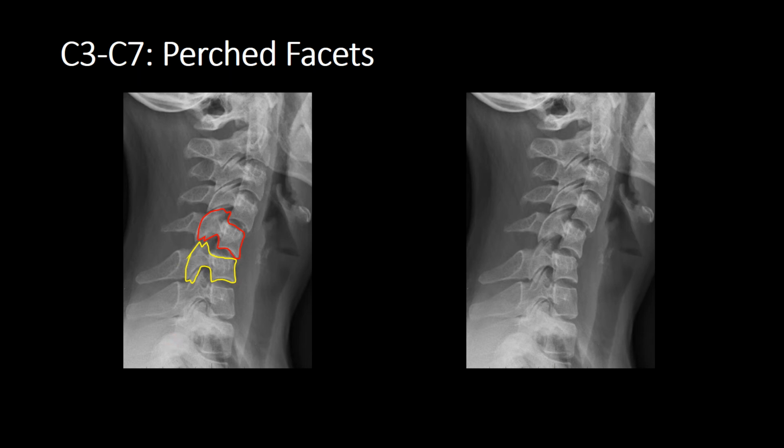Let's look at the interspinous distance. So we've got virtually no interspinous distance, but as we can see we've got rotation here, and so therefore this is normal, should not be misconstrued as abnormal. So remember with that apparent spondylolisthesis, this is a very normal interspinous distance. The facet joints are rotated, so this is just projection. But now we get to C5, C6 and we can quite clearly see there is marked diastasis of the interspinous distance.